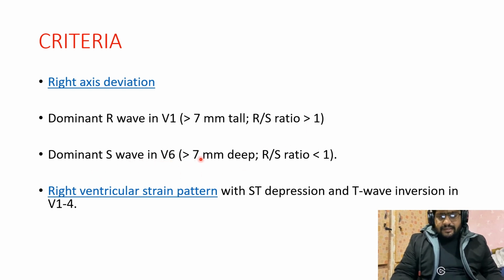I understand that this must be confusing for you at this point, but remember the lead V1 is at the top of the right ventricle. It's on the right side, right? So as we discussed, the R wave shows the ventricular mass. So normally in V1, do we see an R wave? No, we don't. We actually see the R wave more prominently in leads V4 to V6.